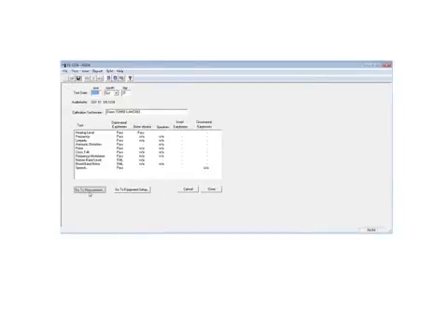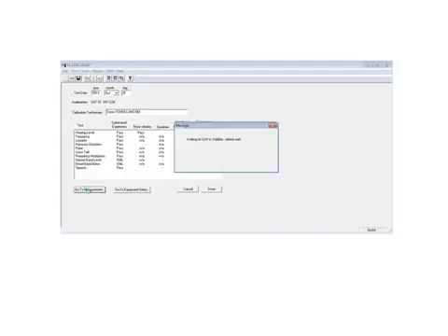So now we can go to the measurement. Right now the audit software is setting up the 824 sound level meter to the proper mode and gain and settings. And the first thing it wants us to do is check the calibration. So I'm actually putting that black CAL250 calibrator over the microphone, and we're watching the measured sound pressure level coming in in the window.